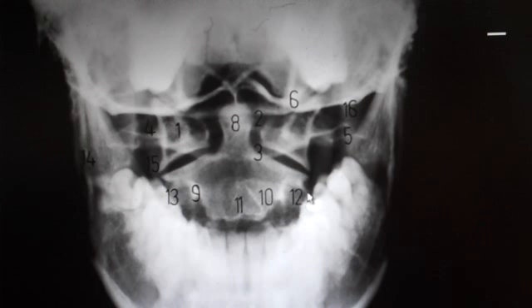But here again, this side is the easiest to see. All of this is the transverse process. It's superimposing part of that tooth. And right here where it's really dark, right to the right of the number 2, is the TP foramen.